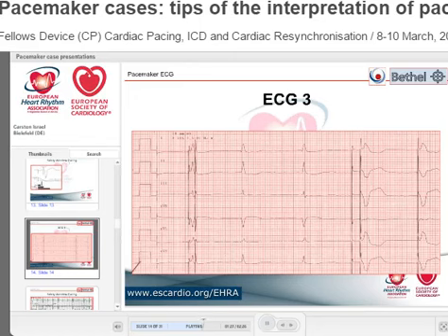What is the basic malfunction of this device? I've heard it already. So if you go through systematically, number 1, what's the basic rhythm? It's irregular, but it's not easy to see. Atrial fibrillation.